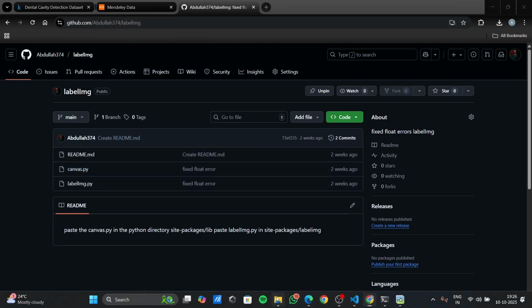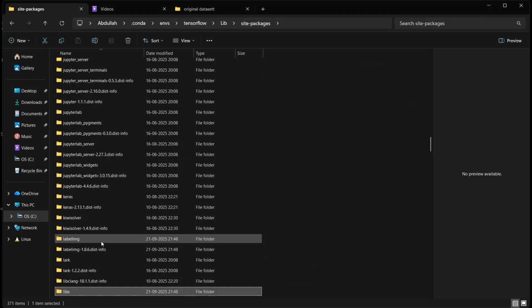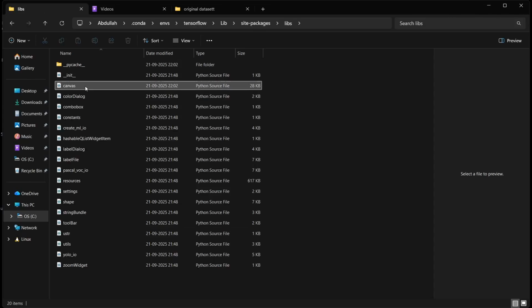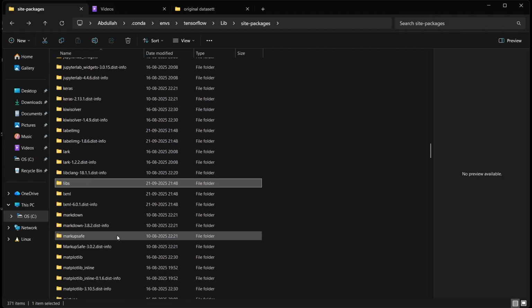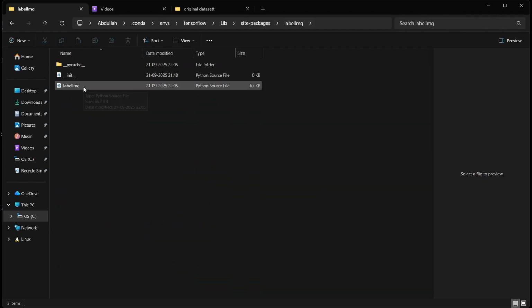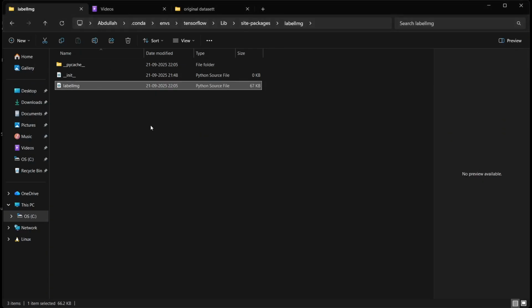So for me, what you're going to do is edit the code in the canvas.py. Here you're going to edit the code, and the other place where you have to edit is, you're going to go to this folder, and download these two files and paste them, so it'll work fine. Basically without changing the code you can't zoom in, you can't edit, it'll crash otherwise. So you just download these two files and paste them wherever I showed you.